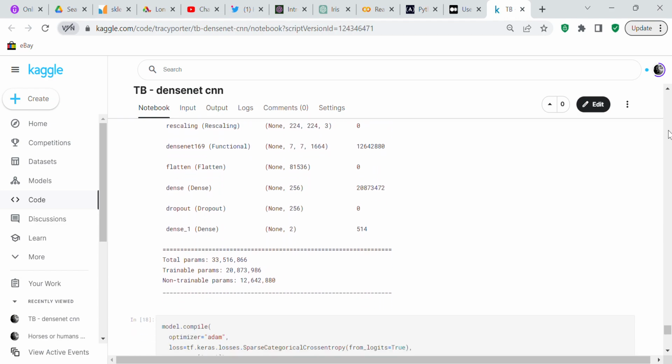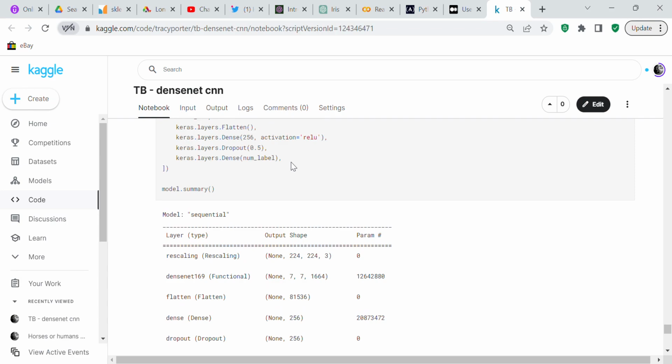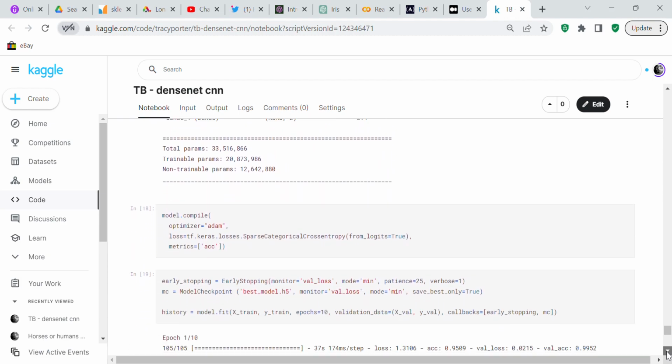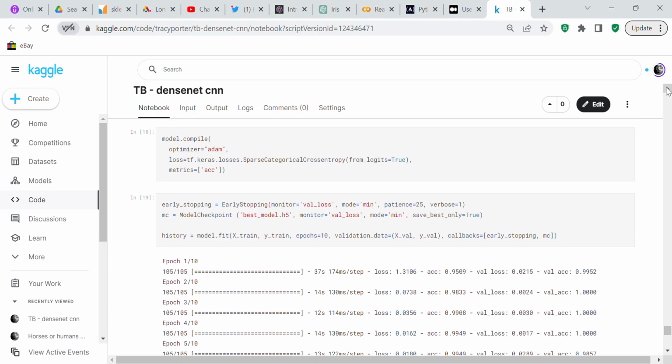So you can see all that. I'm really surprised because we had this comma right here, and I'm surprised that it didn't crash, but it worked anyway. And as I said, I'd been working on it all day long, so I was tired, changing code, experimenting with code, seeing what I could find.